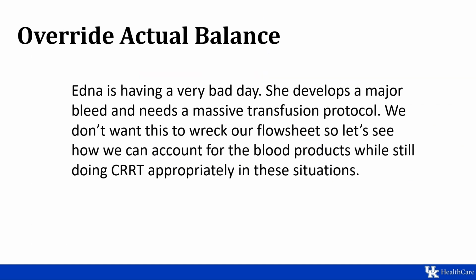So let's talk about some cases when you would use the override actual balance feature. Let's say Edna is having a very, very bad day. She gets a major bleed and needs an MTP. We need to chart the intake because she's getting a whole bunch of blood products. However, we don't want it to wreck our CRRT flow sheet.